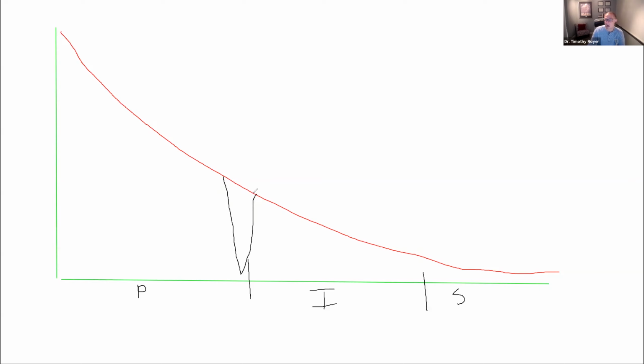It looks very odd. You see the mountain range we saw earlier, all cruising along, and then all of a sudden there's this big cavity in here. You'll see this in movement disorders, because this set of brainwaves is where a lot of our balance and stability comes from. So that's an unusual one. You'll probably never run across it, where the whole 11 to 13 hertz is almost non-existent.